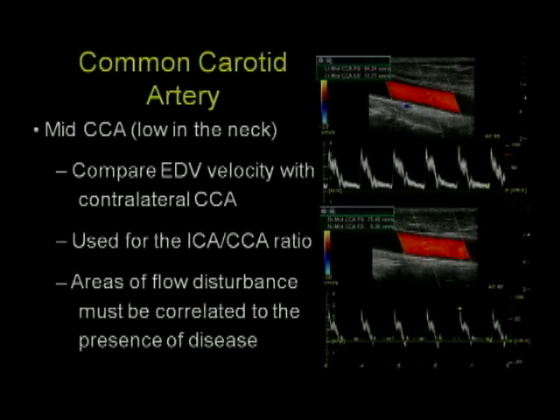I believe that it's important for the sonographer to be well aware of the velocities and the waveforms that they're acquiring and keep an eye on those things throughout the performance of the carotid evaluation. Really, this type of examination requires interpretation as you're performing it, because you may have to adjust your protocols accordingly in terms of the different kinds of pathology that you detect during the examination.